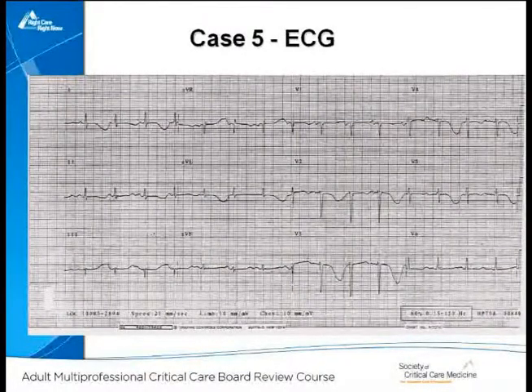There's her standard 12-lead cardiogram. And which of the following would you recommend? Electrolyte repletion, coronary angiography, isoproterenol, amiodarone, genetic testing.